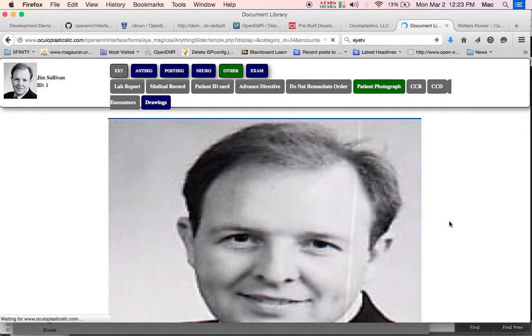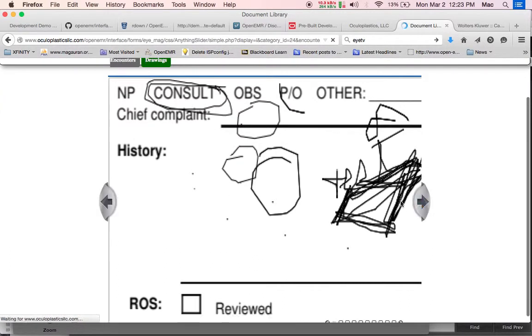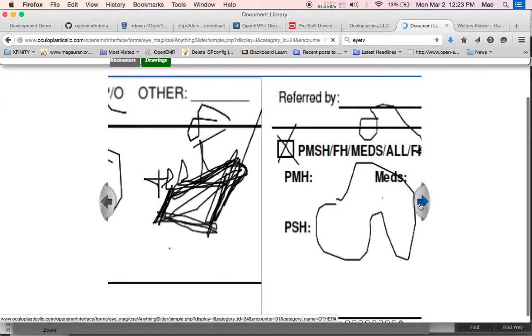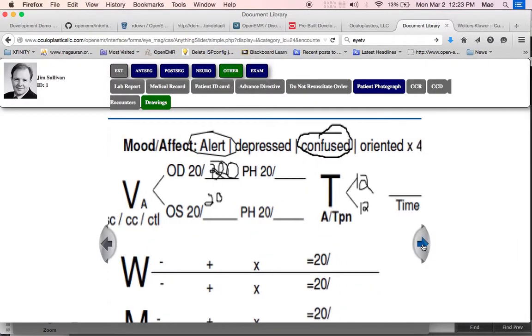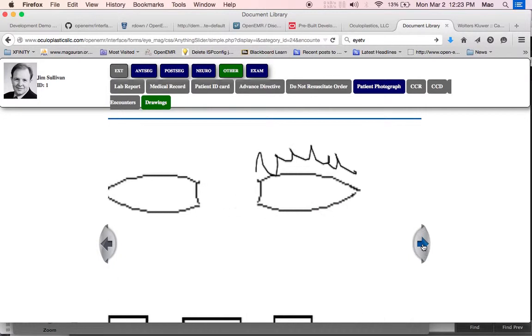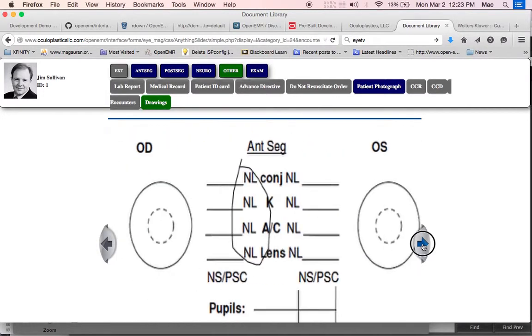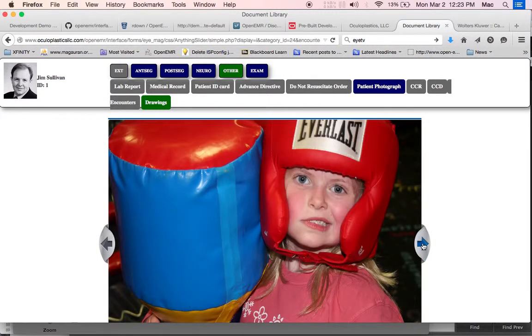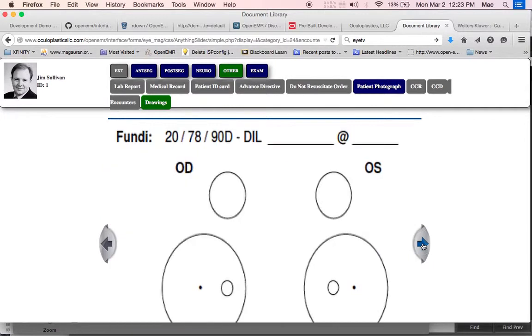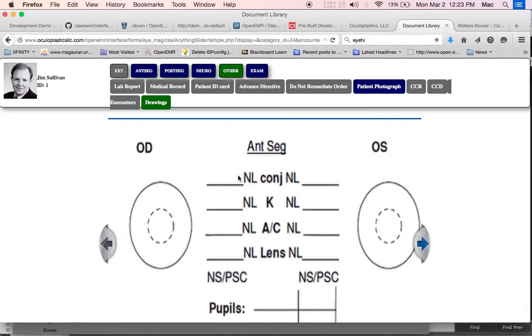Let's pull them all up again. So this was some rudimentary drawing. And you can, if you want, scroll through these one by one. So rudimentarily, you can follow images over time. And that's an image that was added as well. So it doesn't have to be the images that you see here. It's things that are in the miscellaneous or drawing segment.